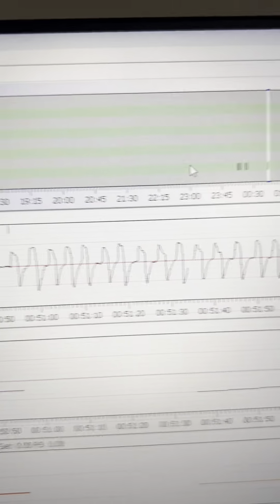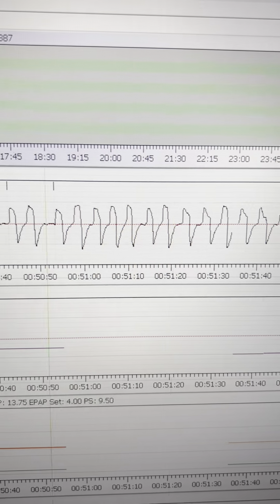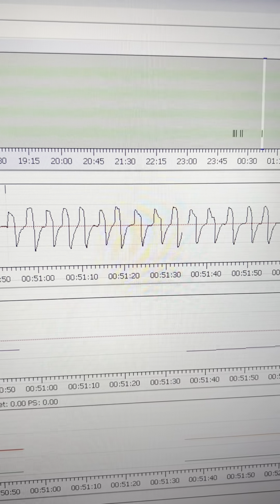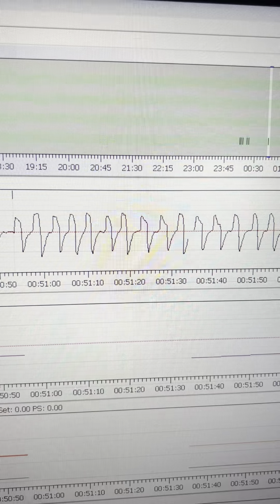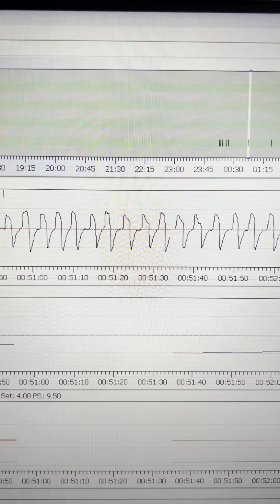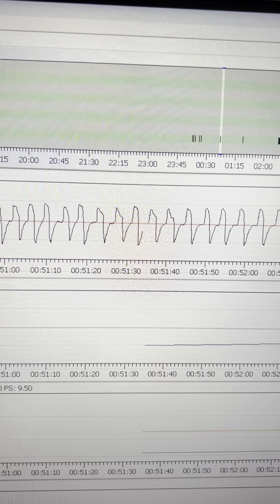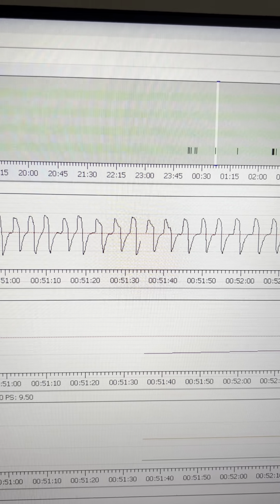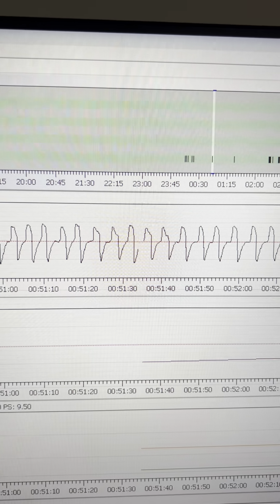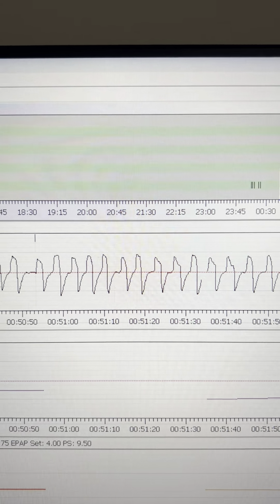And you can see that I don't have those constant centrals, although you're never really sure though. I would just try to experiment with how you feel. When I up the CO2 too much, I feel more sleepy, I guess. And then when I try to lessen it, I feel more wired if it's not titrated properly.